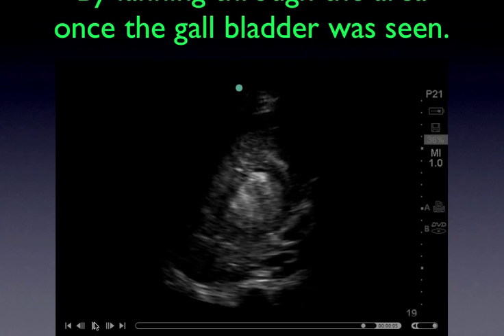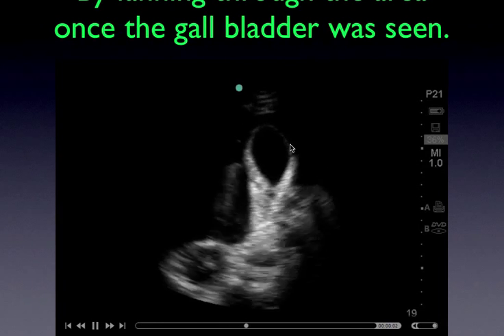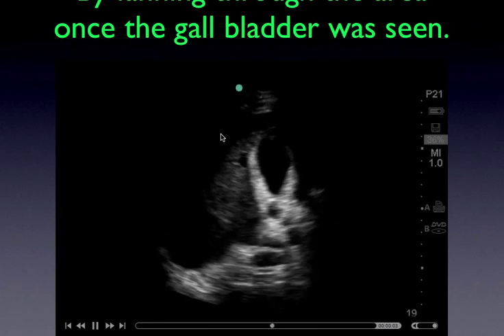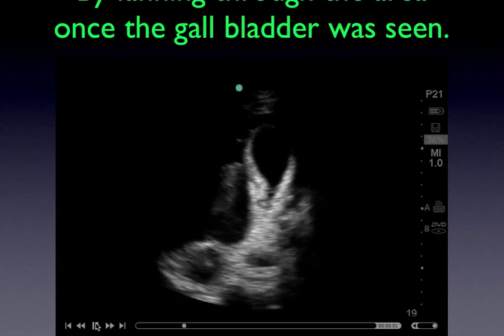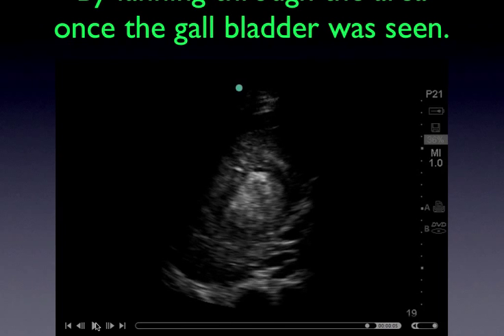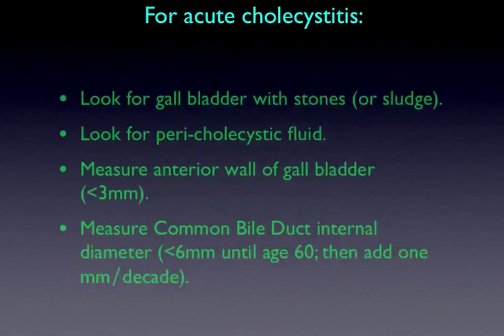So the moral of the story here is, when you're looking at one structure, don't ignore the surrounding structures. There's a reason why this patient has a thickened gallbladder, and that's due to the ascites, which we can see here. And there's a reason why this patient has ascites, and that's not due to his gallbladder disease. That's due to the liver cancer, which was proven by biopsy of this nodule. This mass, actually, not a nodule.